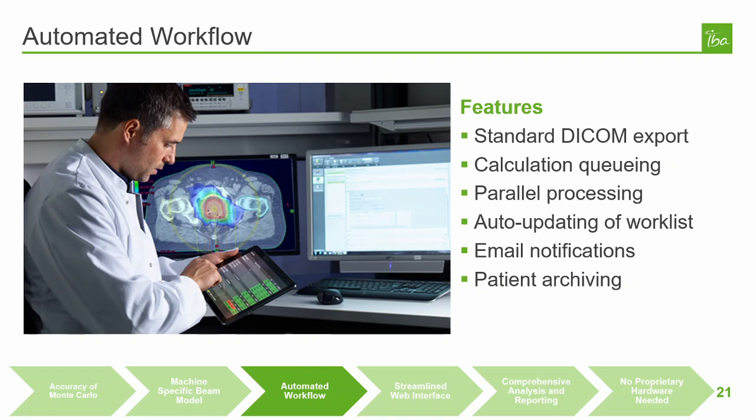The SciMoCa workflow has been designed for ease of use. Calculation jobs are automatically launched and run after the plan has been exported from the treatment planning system to the incoming DICOM folder. When the dose calculation is complete, the patient is automatically added to the patient work list, and optional email notifications can inform you of the new cases to review.